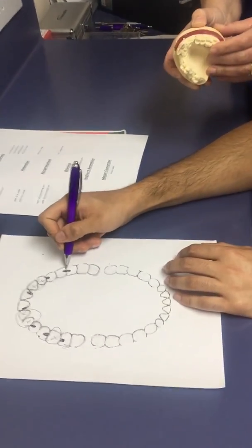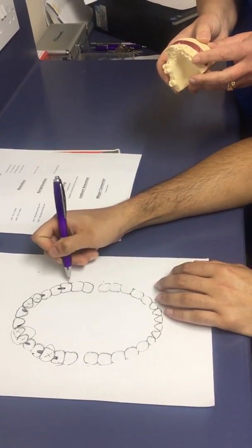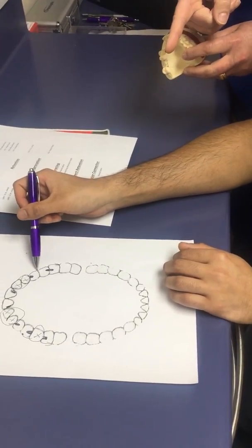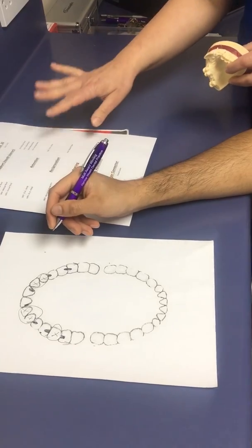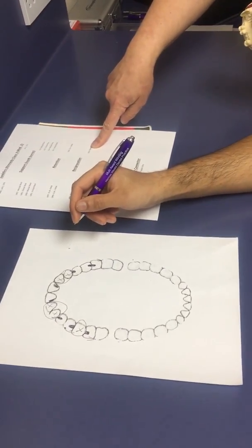Yep, good point. And then on the contralateral side, you need a clasp here on the 6. And why are you putting that clasp there? I could have put it more anteriorly, but once again, it could have been in the smile line, and I didn't want that to be the case, and the patient requested that. Okay, not to show that. Okay, so you've done retention. Now we're going to talk about reciprocation. Can you tell us what it means?